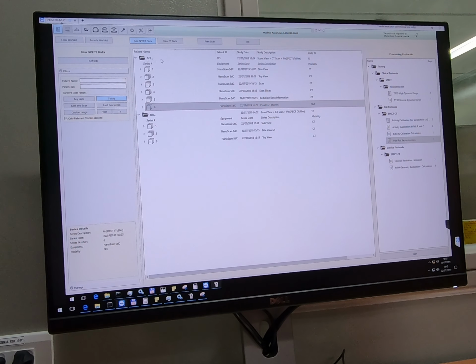So this is the study name we have created. And this is the study date, a kind of parameter you can use for making the list, to make an order according to the date you have acquired them. But what can also tell us more is the modality.